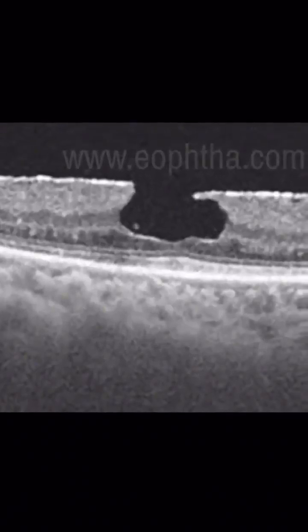Oh, that's a good example of a patient that has a pseudomacular hole. And well, what do you think? Do you think the visual acuity is bad or is good here? Well, if we go based on what we just said, ISOS is present, RPE is present and intact, this patient probably has good visual acuity, even though it looks a little counterintuitive because the upper retina, the inner retina is disrupted.